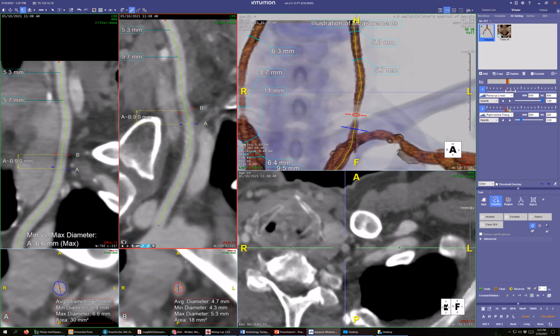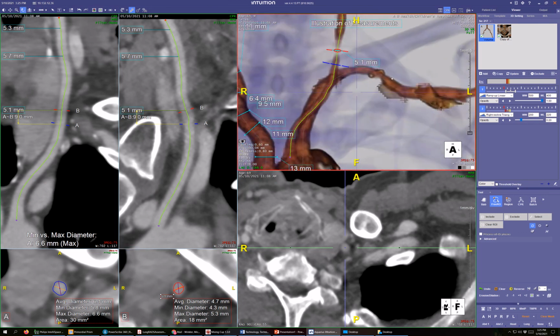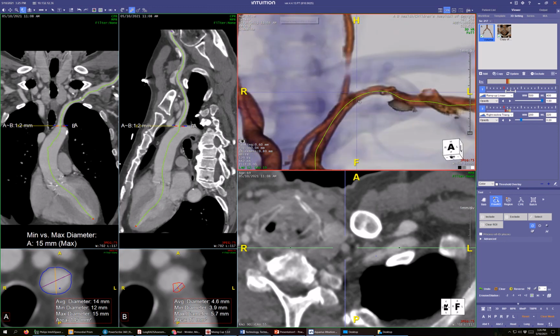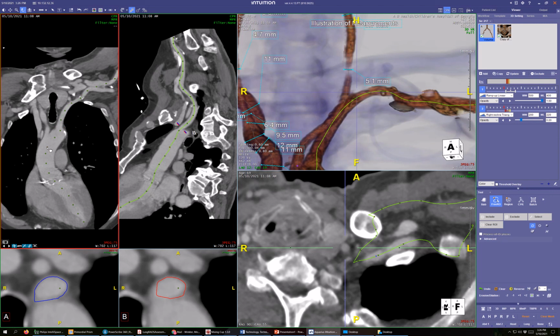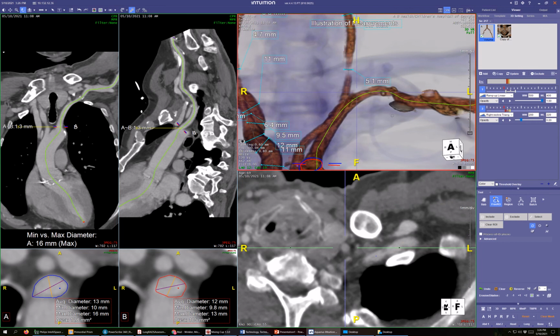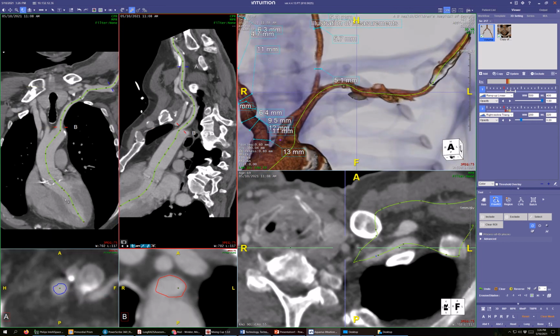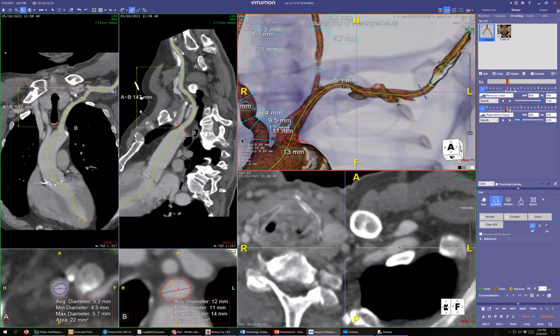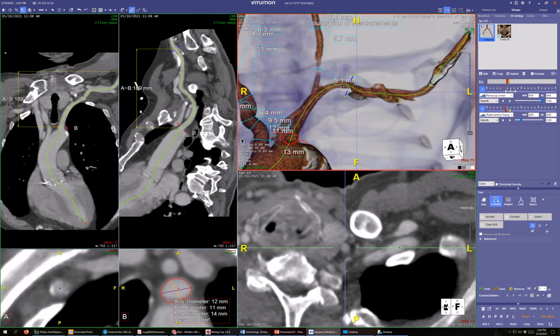If we really get serious about doing instructional videos, maybe we'll have you come and I'll just post-process and you can talk. I still need to learn your technique, like this very fancy. Yeah, I got a good one printed out around the wall. It's very beautiful. Well, we're not doing anything perfect today.